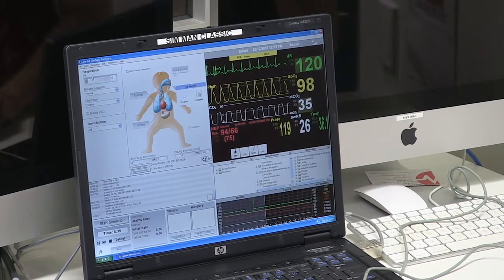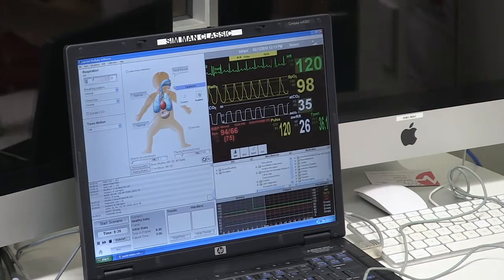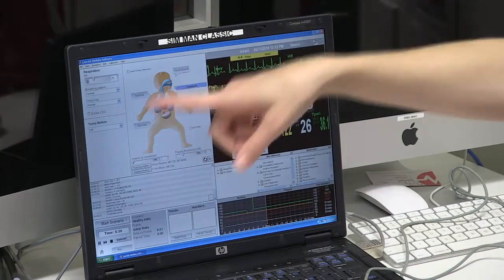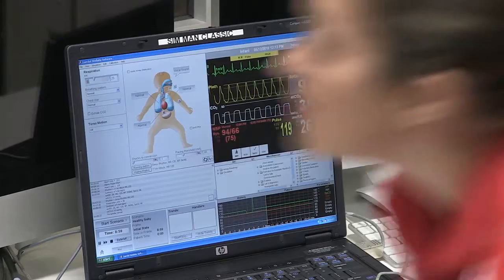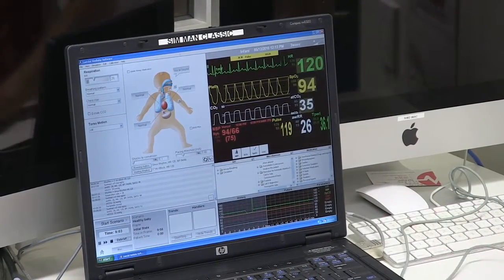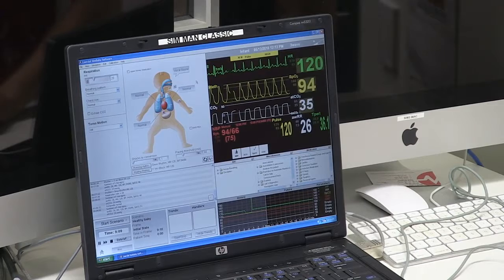You can just hover over this one. You've got the cyanosis, so that's enabled. If the saturation drops to 55 or 60, you'll lose the saturation on the monitor. And if it drops to, I think it's 89, low 90s, you'll get the coloration. I can't really see. So keep that in mind. Just make sure that if you want cyanosis activated, you have it enabled on your computer. And that's pretty much the standard operating one.